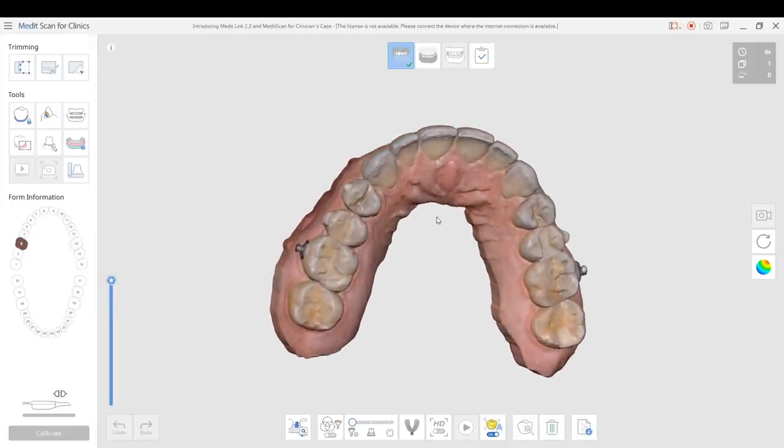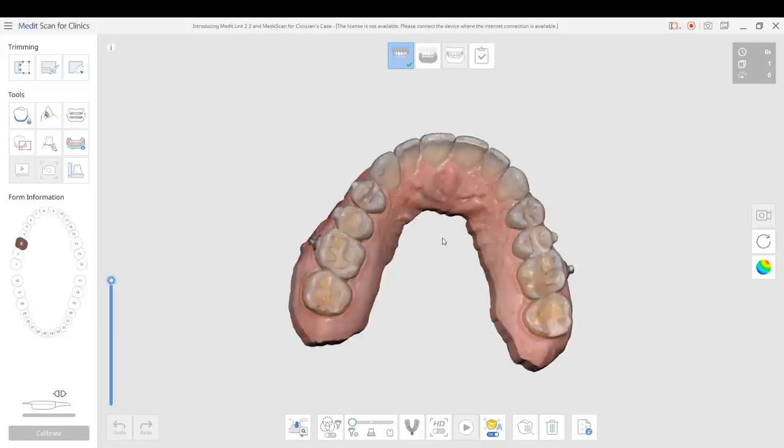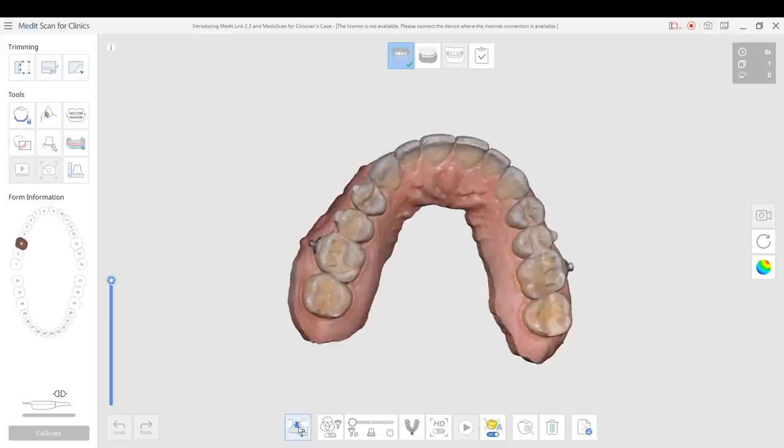So to be able to bring in a 3D model, turn on your scanner, have it recognize the surface or whatever you're scanning, and then continue building a model to that. That is a feature we've never had in digital dentistry before, and you'll see some examples of that, which is phenomenal.